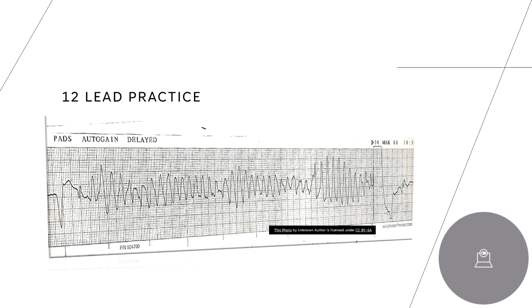Hey guys, this video is solely on reading EKGs. For those of you who are new to reading 12 lead ECGs, this is pretty much the bare bones of simply looking for STEMIs. This video is not about bundle branch blocks. It's not about rhythms, rates, and I'm not going into measurements. This is simply about finding STEMIs.